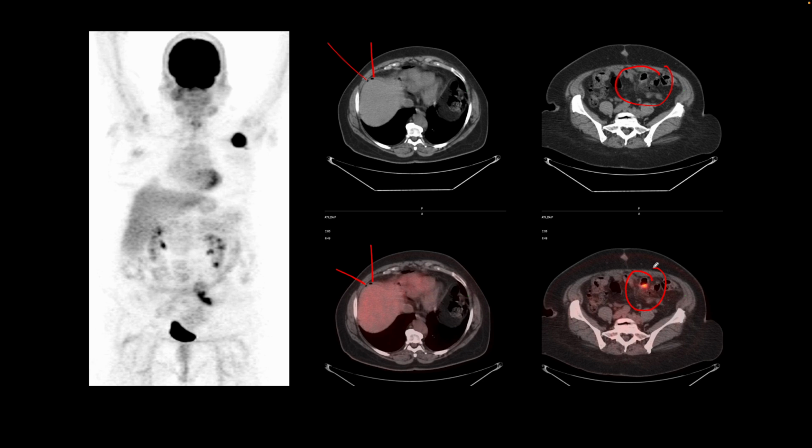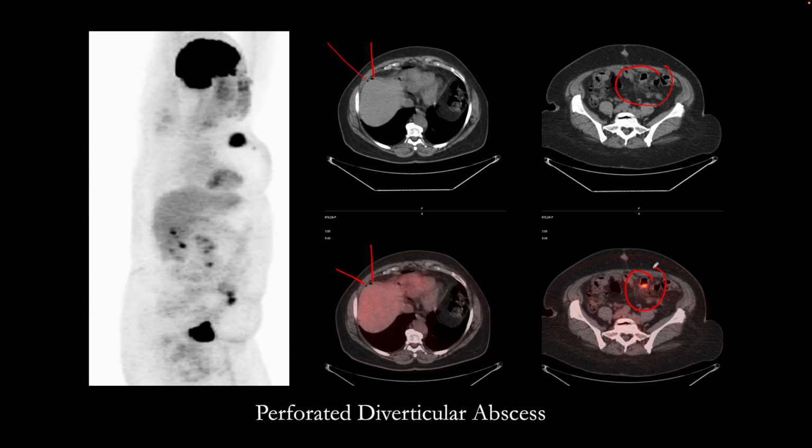Be aware these findings are there. You have to pay attention to the CT that comes as a part of the PET-CT. It may be low dose, it may be without contrast. It's very limited, but make sure you don't miss such findings.